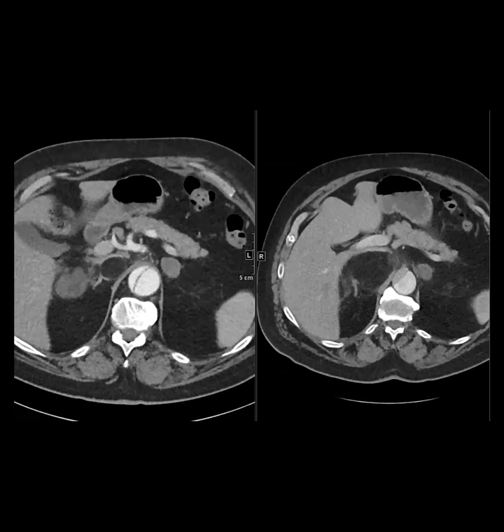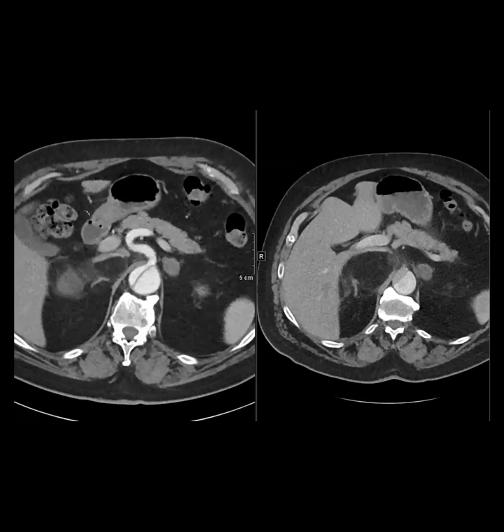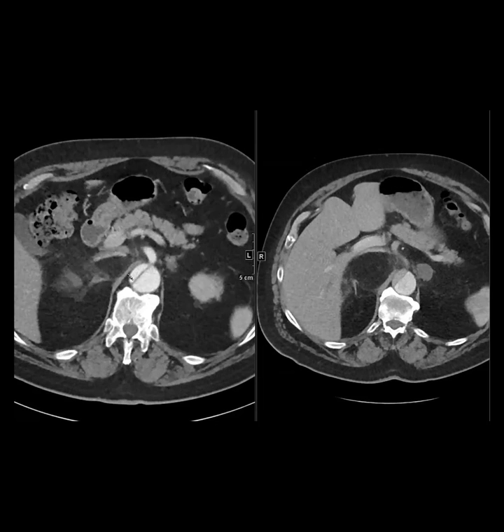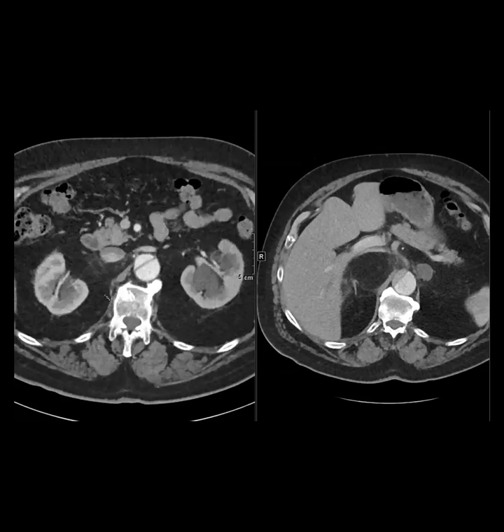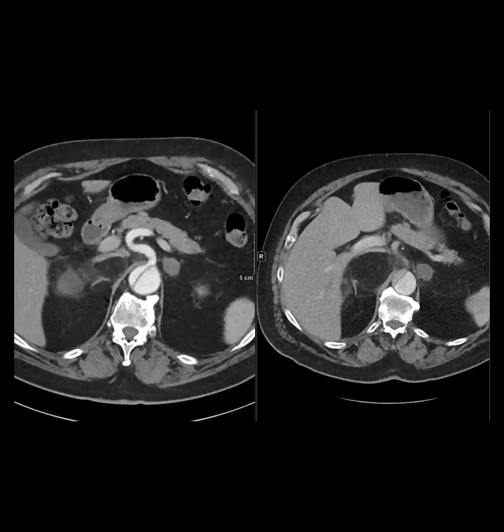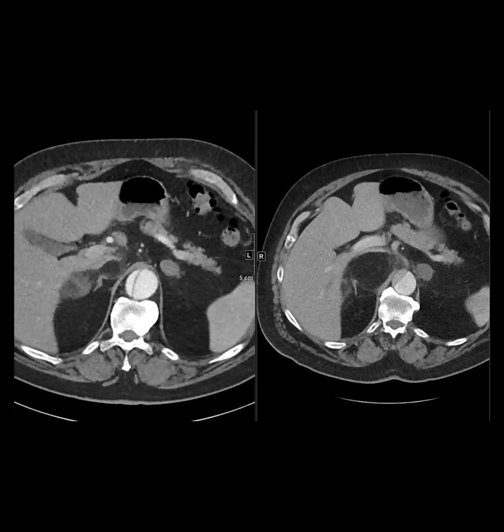Any other? That's a great pitfall. That is a great pitfall, actually, that specific case, because I would have called that myelolipoma in the first. Yeah, I mean, I guess it is surrounding the whole thing, but I don't know if I would have thought that looking at it originally.